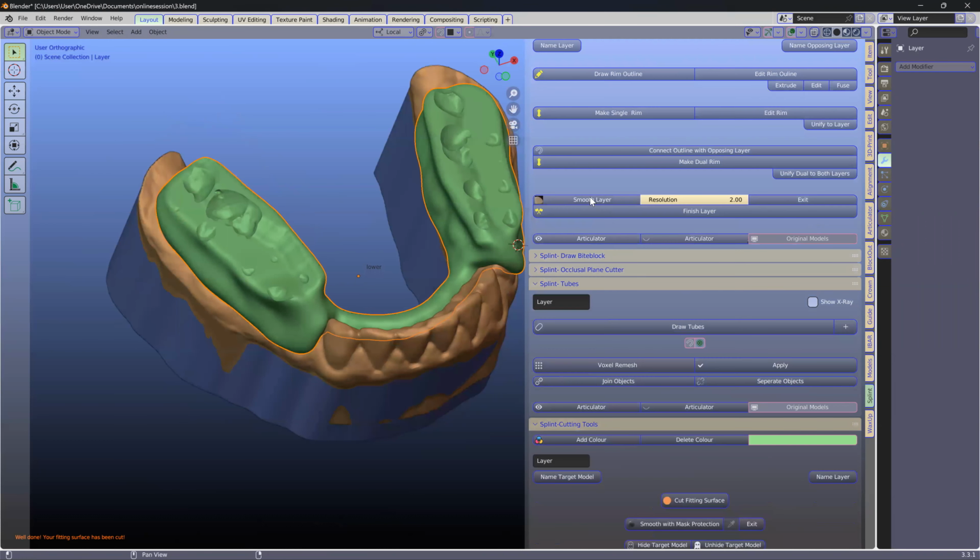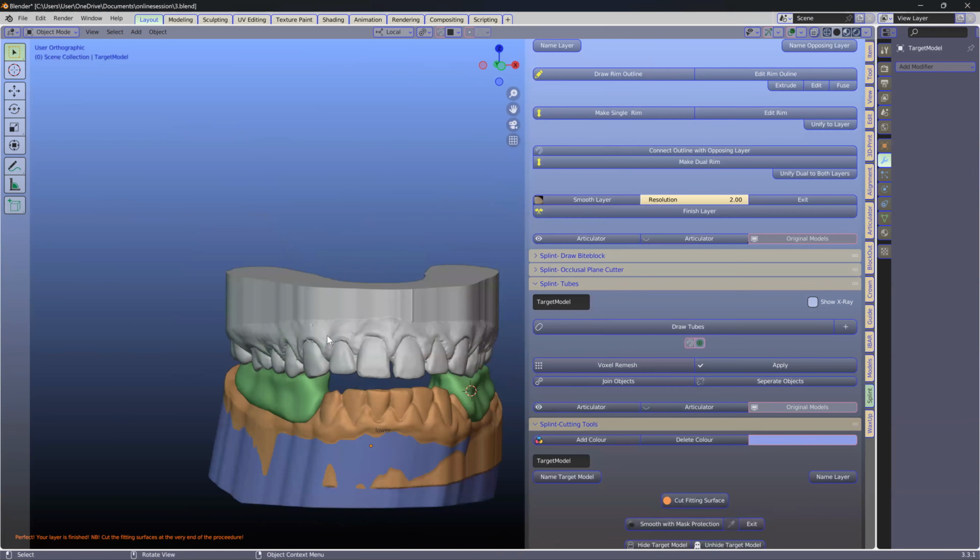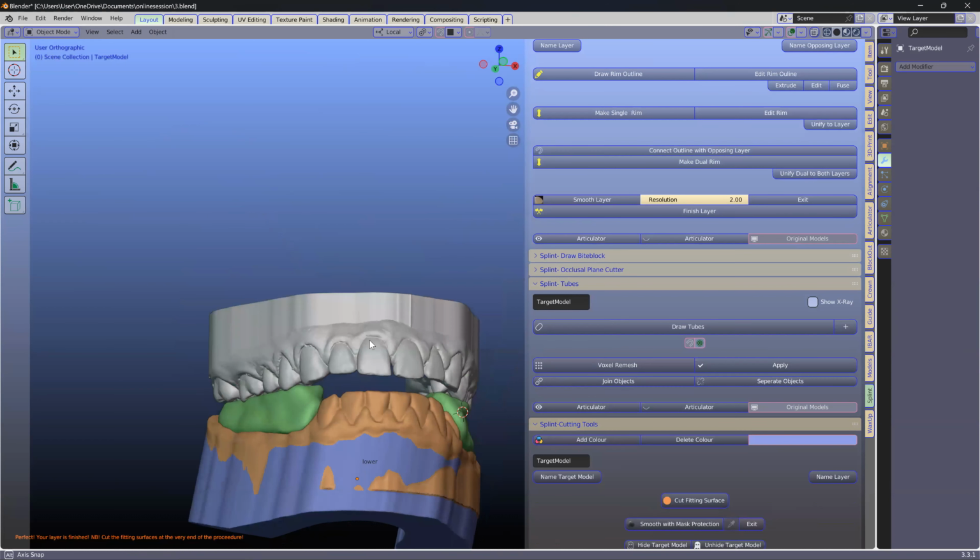Have you got any questions as far as that's concerned, or are you sort of okay with it so far? If I want to keep those sharp, I don't have to blur it, basically. Yeah, just smooth it down or whatever. Every time you exit, it's going to remesh it so that you get a good printing mesh, because smoothing can sometimes corrupt the mesh structure. That's not only in our software, but other software as well.